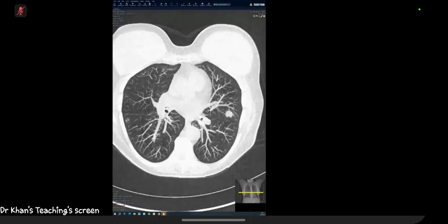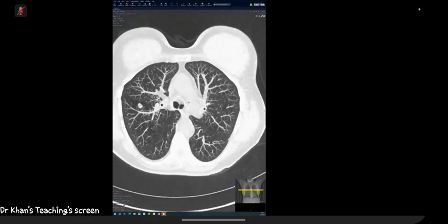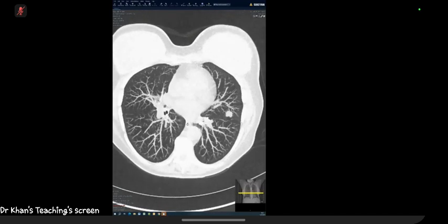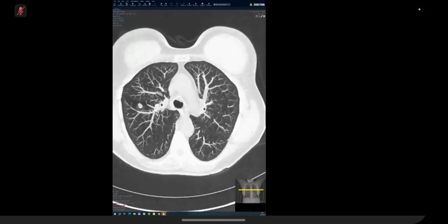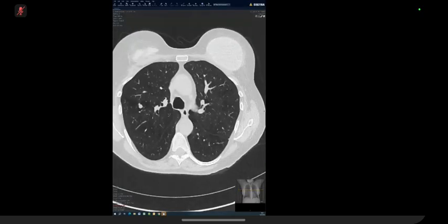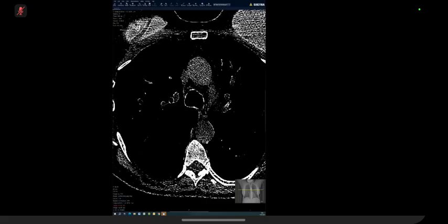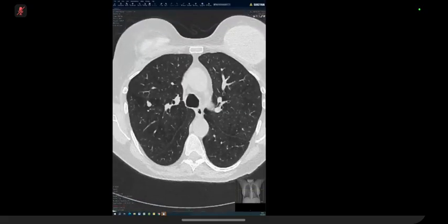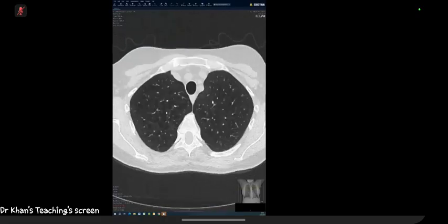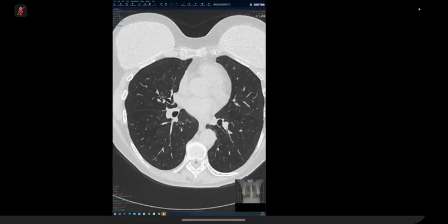So I'm going to map it so you can find anything else. Okay. So there's the nodule within the right middle zone that I saw on the chest. This one? Yeah. So you found two nodules, different size. What do you want to ask? Is there an abdo-pelvis? Is there history of previous malignancy? No, there isn't. So how do you want to approach these nodules?